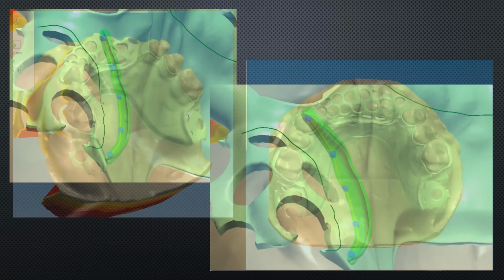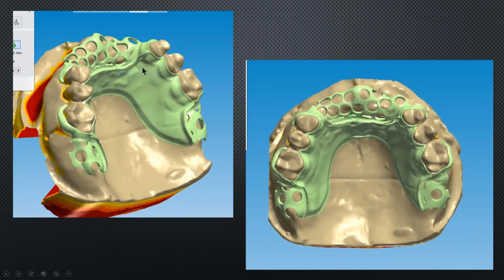And so here's our finished frame. I will say, kind of my experience between 3Shape and Exocad, that with 3Shape, whenever you say, okay, here I'm done, it seems to be more done. When you click your finals on your Exocad, there's a lot of smoothing and melding your finish line into your major connector and kind of making a smooth transition. There's a little bit more of that compared to 3Shape, but both seem to, there's a reason why they're the two big guys in our industry. Both of them seem to work really, really nicely.